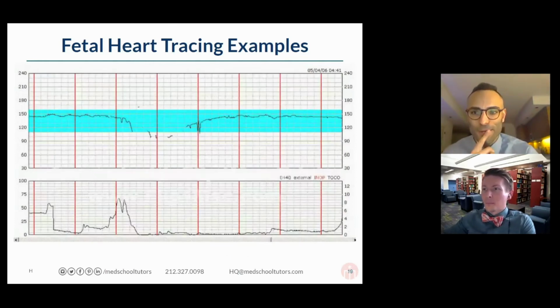All right. So again, no more training wheels. I think we should go ahead and think about what we're seeing with respect to the heart tracing and look at the contraction. Always have this kind of approach of looking at the peaks, and when beginning the heart tracing, that dip begins. What is this heart tracing?